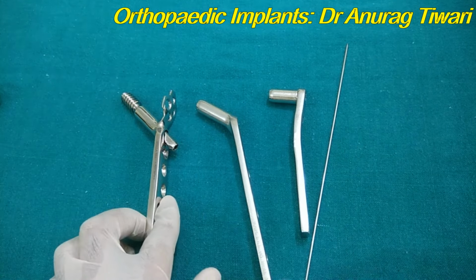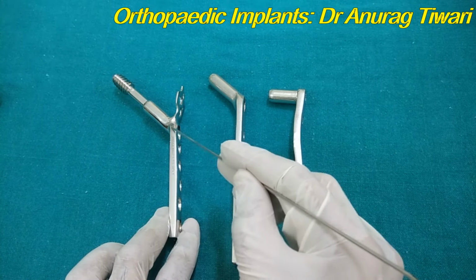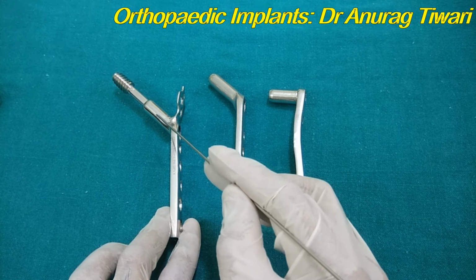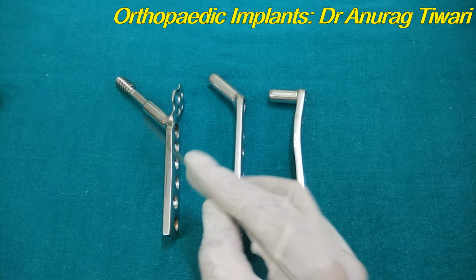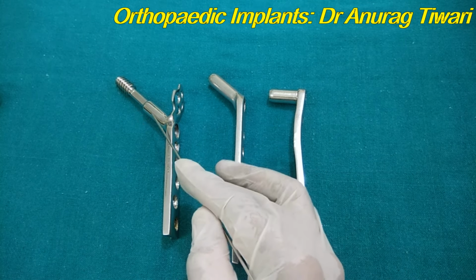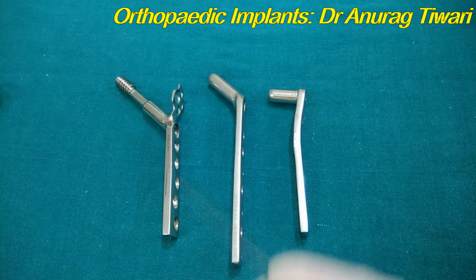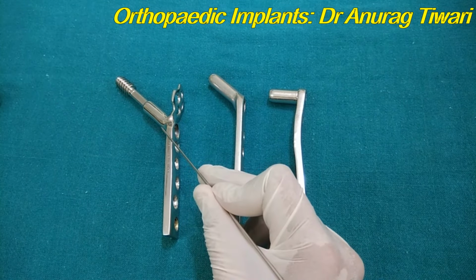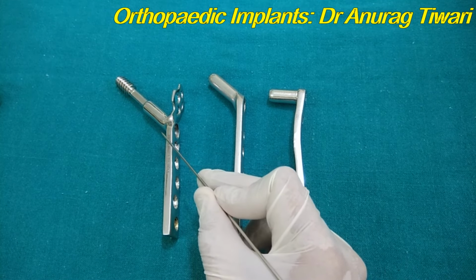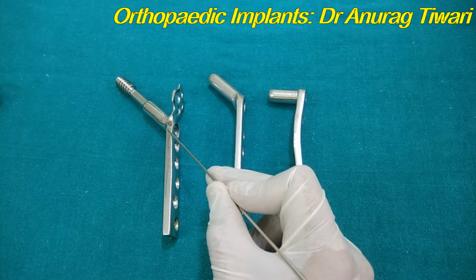So that is the principle of the DHS, and the correct site of entry of this screw is center and center. Center in the AP view, center of head and neck, and center of head and neck in the lateral view. However, if it is very difficult to achieve center in the AP and center in the lateral, then posterior-inferior is the acceptable position: posterior in the lateral view and inferior in the AP view. So you should aim for the posterior-inferior aspect of the femoral head, where the bone quality is very good and you will get a good purchase. So center is the first position of acceptance, and the second acceptable position is posterior-inferior. However, the antero-superior quadrant of the femoral head should not be aimed at, because there the cutout chances, the failure rate of DHS or DCS, are highest.